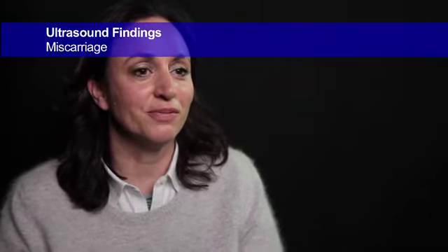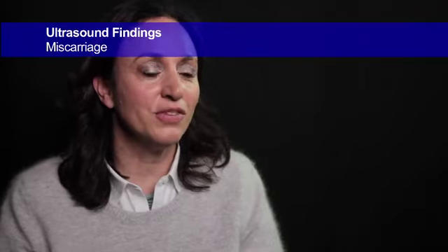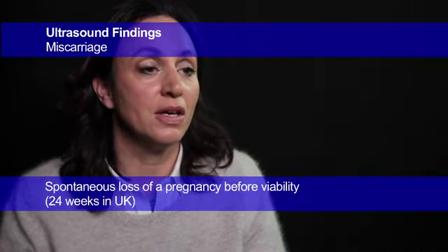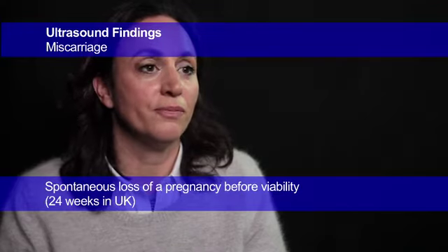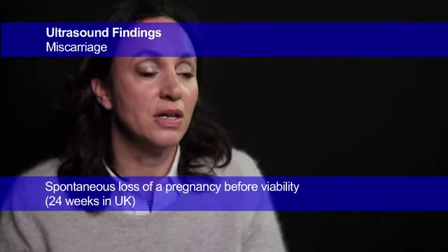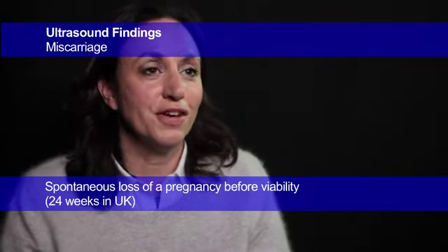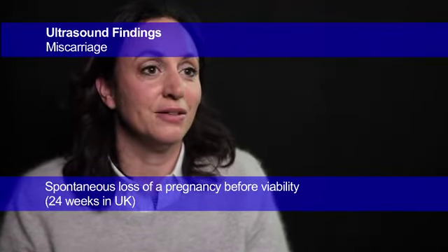Okay, now we're going to look in more detail at the ultrasound findings in miscarriage. I make no apologies for the repetition, so we will be going over some of the material that I've already covered. How do we define a miscarriage? A miscarriage is defined as the spontaneous loss of a pregnancy before viability, which in the UK is defined as 24 weeks of gestation.